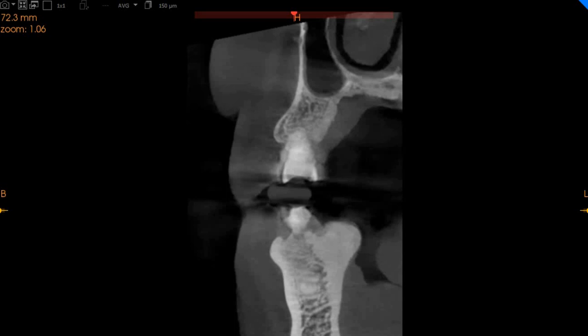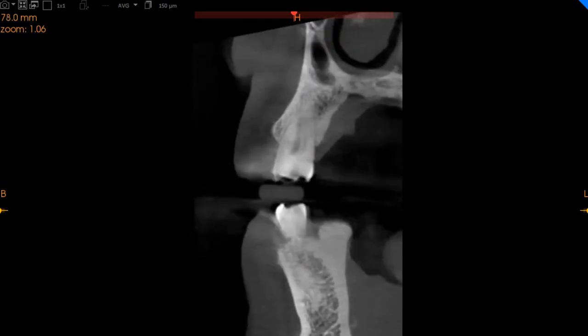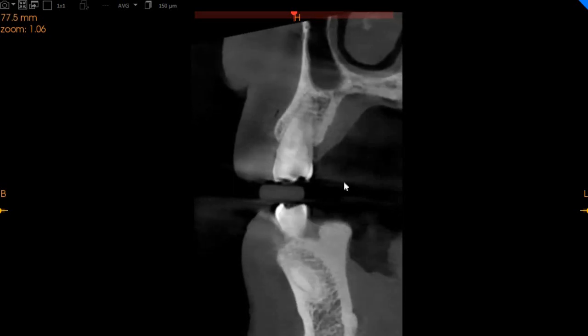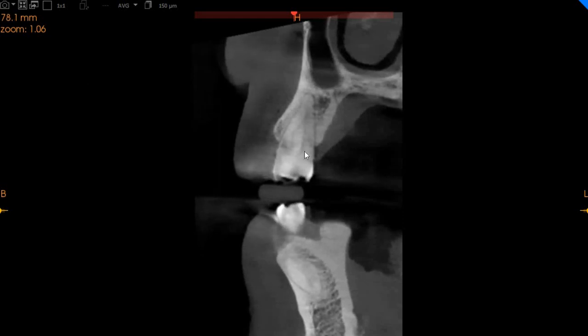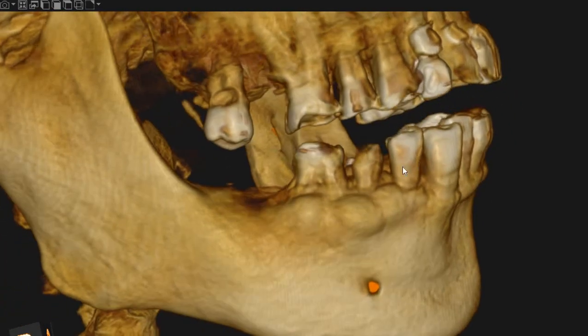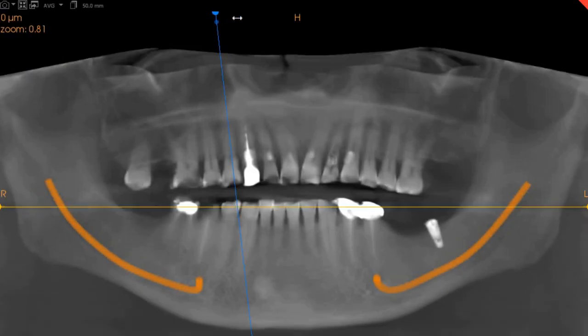We've got the upper right 5. Looks absolutely fine to us on the x-ray here. Very attrition teeth. Teeth are not doing well health-wise. Enamel is very weak. But on the 5 and 6, we don't see any major cavities. We see something right here on the 4 and the distal of the 5. We're presuming it is because of cervical burnout and a cavity on the distal aspect, but nothing very significant for endodontic involvement.